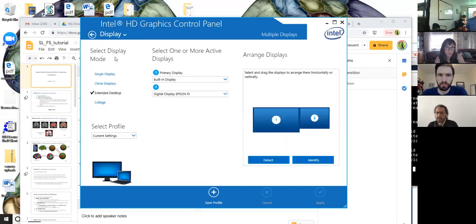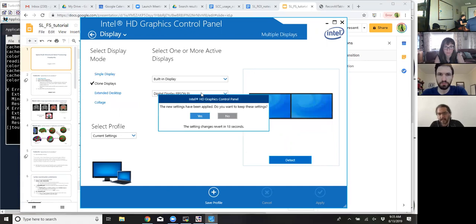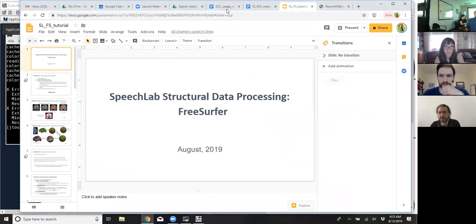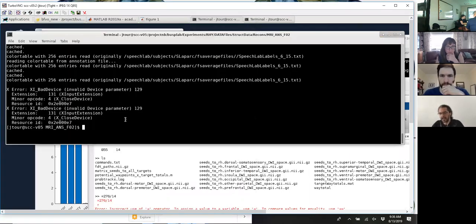Okay, so that would be just reading. You can use REX, the GUI or the command line. If you use the command line, the two parameters that you need to send are first the file that you are reading data from, and then second the ROI defining file. For the data that you are reading info from, you can use the one that is called, I think, results.mask. When you have voxel results in the GUI and you click export mask, it creates a number of files. One is like an ROIs file that has a different index for every ROI, and one is just a mask of ones and zeros.